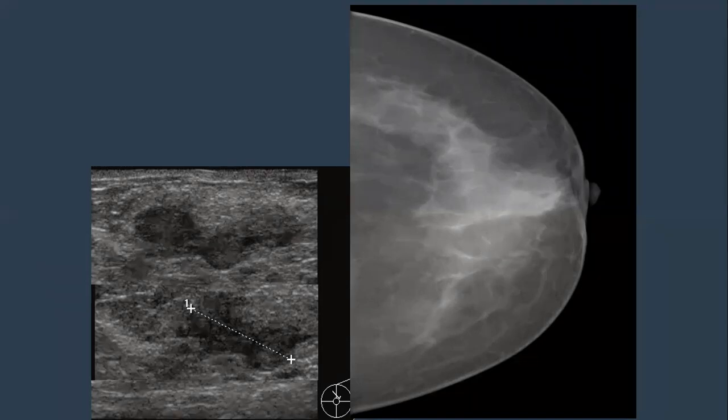Yes, it is a duct. But it is a simple duct. No, a mass within a duct. Yeah, a lobulated soft tissue mass within a duct and associated with architectural distortion. So what do you expect? Just put in your mind the etiology. We described it before. Which etiology? What are the soft tissue masses within the duct?